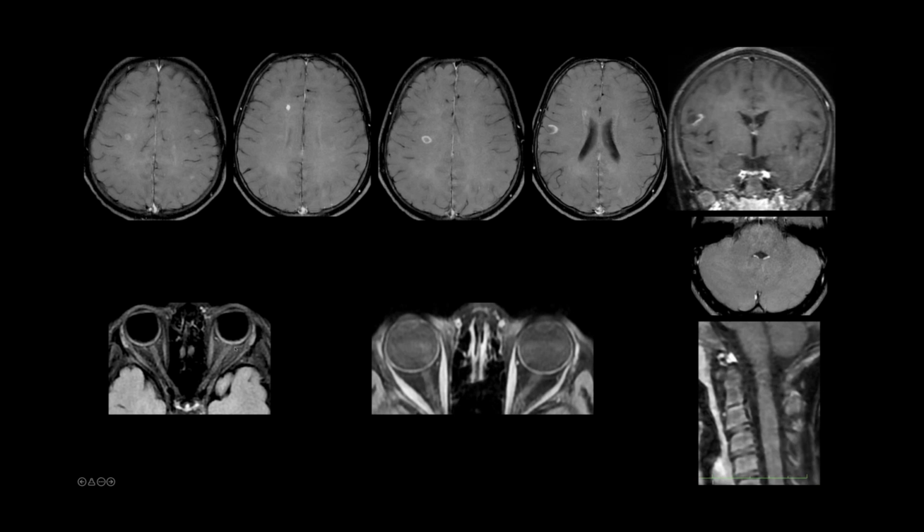These are the non-contrast images of the orbit and optic pathway. No edematous changes demonstrated, and post-contrast, I could not appreciate any enhancement. Probably there is some mild degree, but it is not clearly evident. On the post-contrast sagittal, I'm not sure if these are enhancing foci. We don't have an axial, so I can't tell if these are two lesions or not.